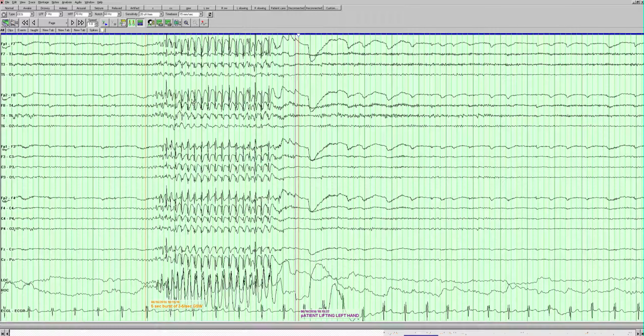So we see these are spike wave discharges. We see a spike wave, spike wave, spike wave. So that's what those are. They're spike wave discharges. We also want to mention the location. And these are diffuse or generalized. We see them in all of the leads. They're not just in one specific area, but we see them throughout all of the electrodes. They do look like they're higher amplitude in the anterior head regions, though. You can see these spikes are higher here in the front, and you don't see them quite as much in the back.